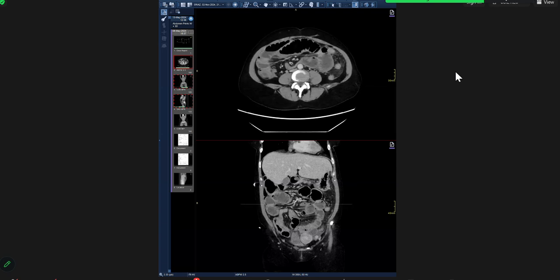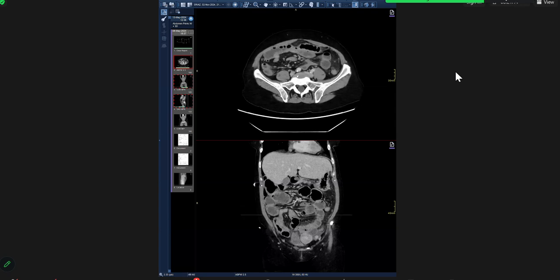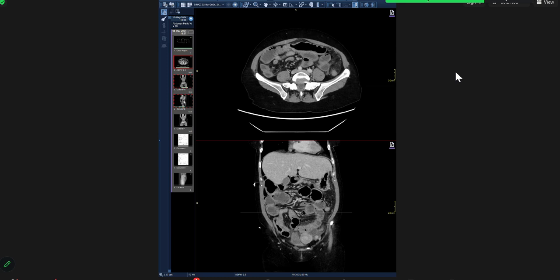I could not see any transition. So you said there's no transition point. I agree, there's no transition point. The surgeon looked at this patient and you see the normal bowel loops here. So this is then what? This is an ileus, right? When there's an ileus, what is the cause of ileus?